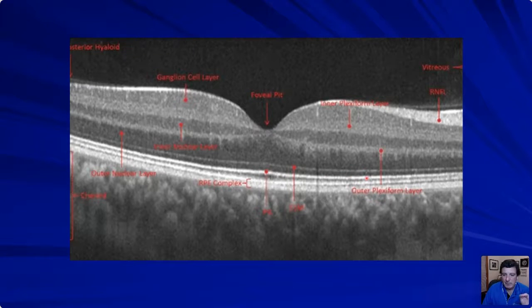Let me just tell you the importance of that. Why is that light up hyper? That is nothing more than tightly packed mitochondria. And remember, the mitochondria are the powerhouses. As we start looking at some retinal diseases tonight, when these mitochondria are starting to die or go dormant, that's when we really start getting concerned about how the retina is being stressed, either from diabetes, or from something in the inner or outer retina, or is it something from macular degeneration?